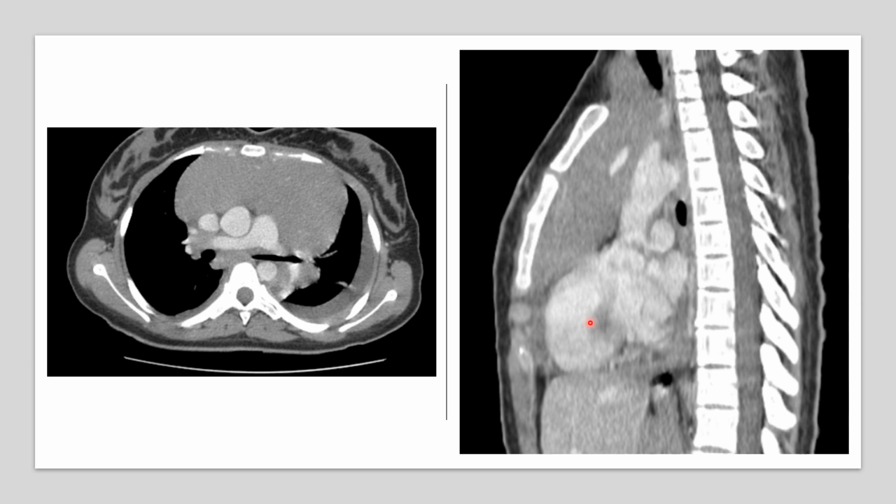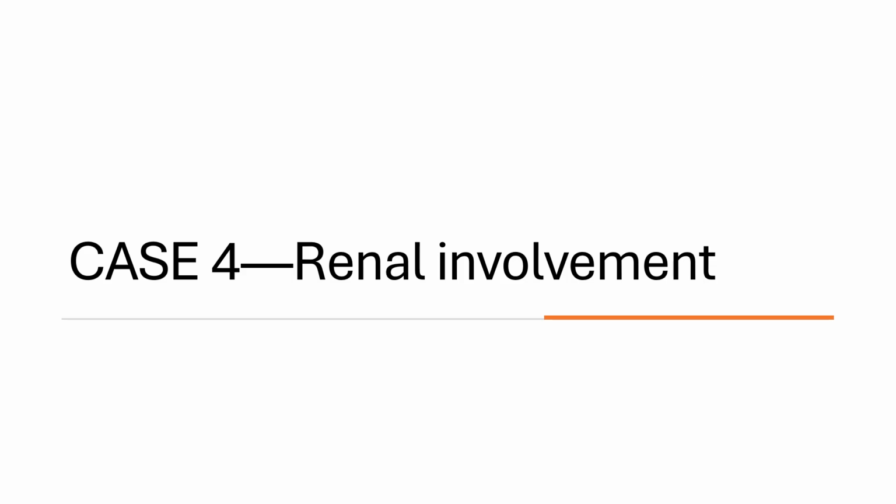Again, we can also see in the axial image that there is moderate pleural effusion on the left side. So it was a case with massive enlargement in the anterior mediastinum, and on further investigation the lymphoma diagnosis was made.